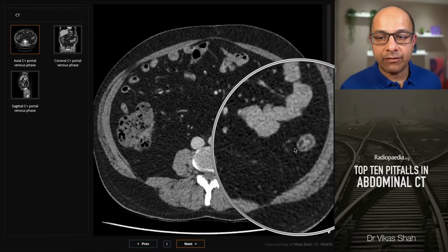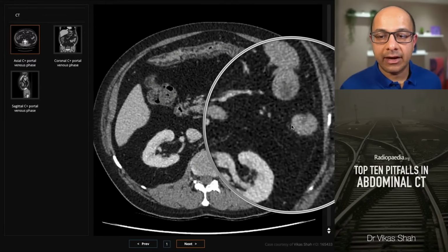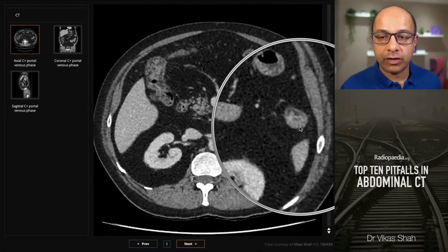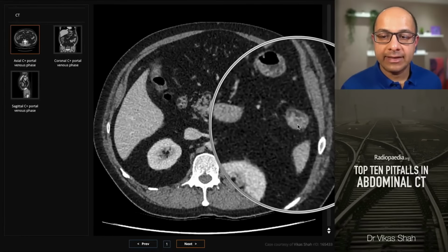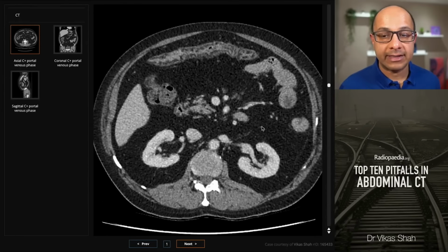examine it really carefully, because if you see it being lost, like here, where you have this semi-annular soft tissue density replacement of the submucosal fat at the splenic flexure, and then when you go proximally, you're back to normal fat, distally, you're back to normal fat. This is highly suspicious for a new adenocarcinoma on the background of long-standing UC. And in fact, in this case, this was proven at endoscopy and with histopathology analysis to be an adenocarcinoma.